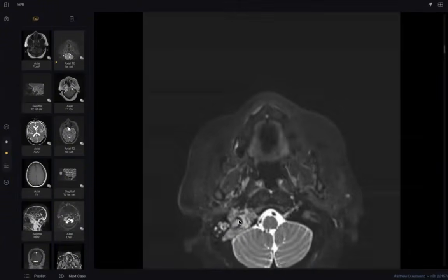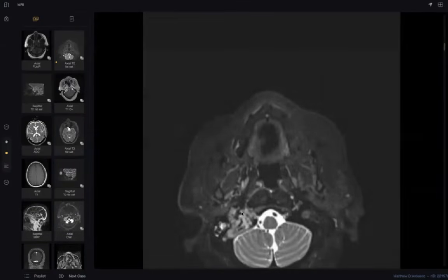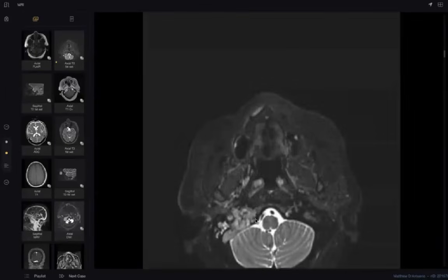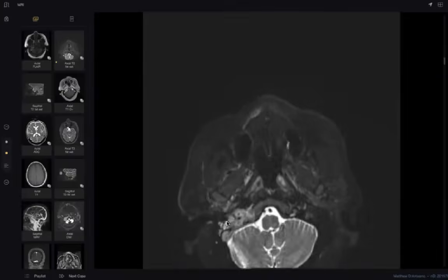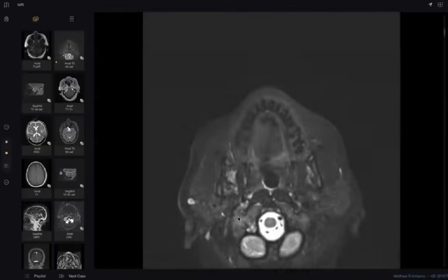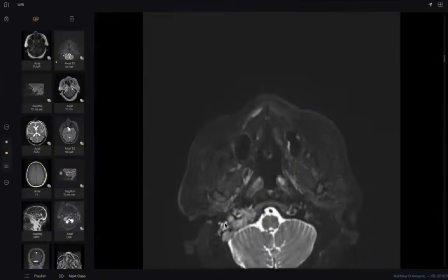So here, this is again a demonstration of the mass lesion at this area. There are multiple signal void areas also seen, which again favors a tumor like a paraganglioma involving the jugular fossa. There is also evidence of mastoiditis seen on the right side.